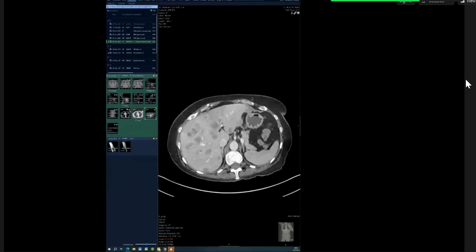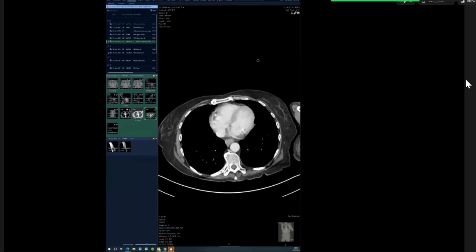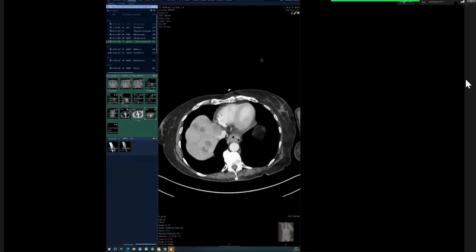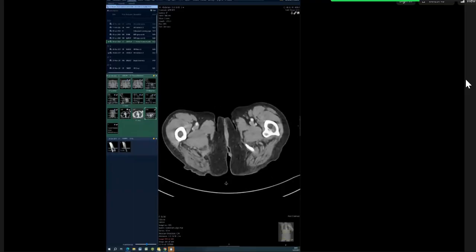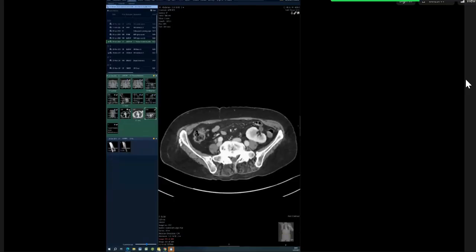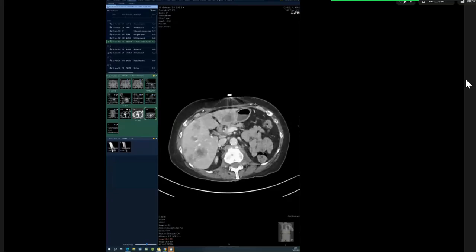They're not going to give you a liver lesion only scan. They want you to find the primary, and they want you to have a systematic way of thinking. So when you have liver lesions but the lungs are normal, you're automatically, rightfully thinking GI tract. So you've said colon. Unless it's a CTC, they're not going to make you look for a very tiny circumferential bowel thickening on a CT. It would be something more obvious.